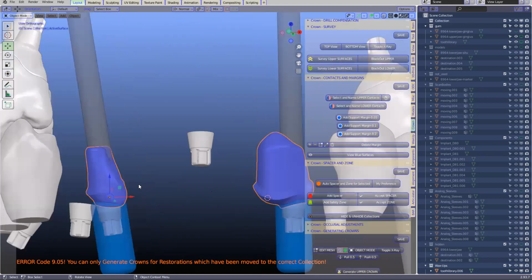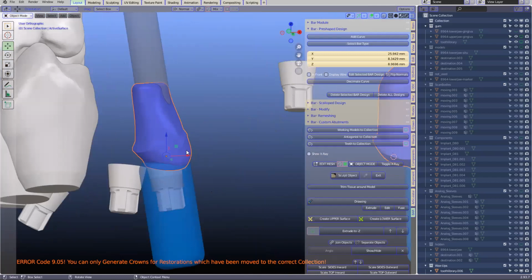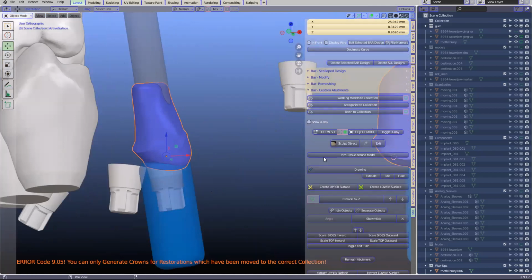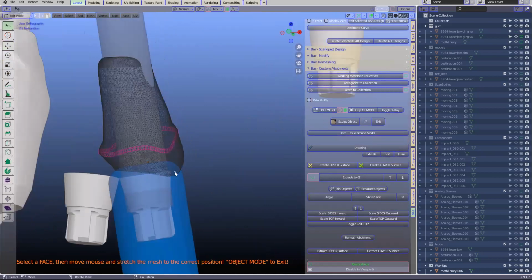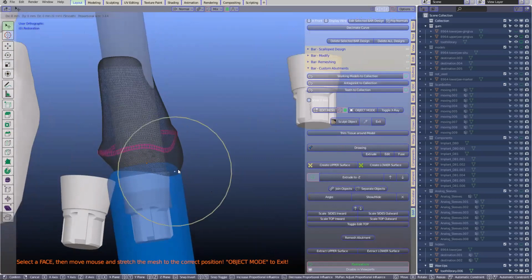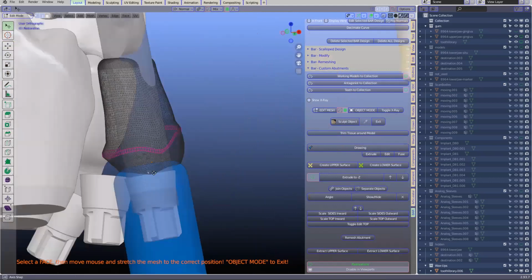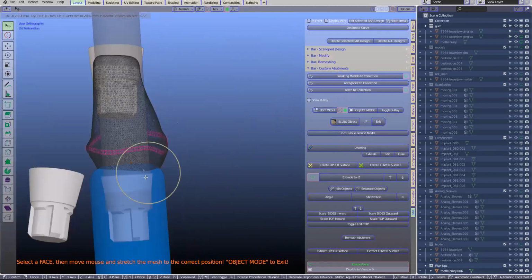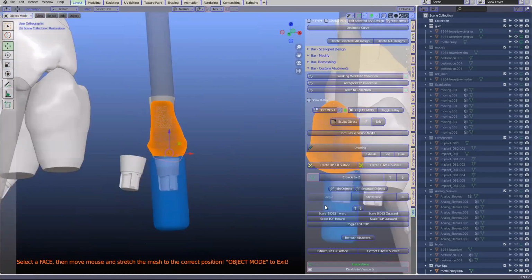So now you put your surfaces on, but this time I just want to correct this one here, because remember it was a little bit below where it should be. Okay, so proportional editing is on. I'm going to take this and shift it inwards a little bit like this, as long as it's above this protected purple line.